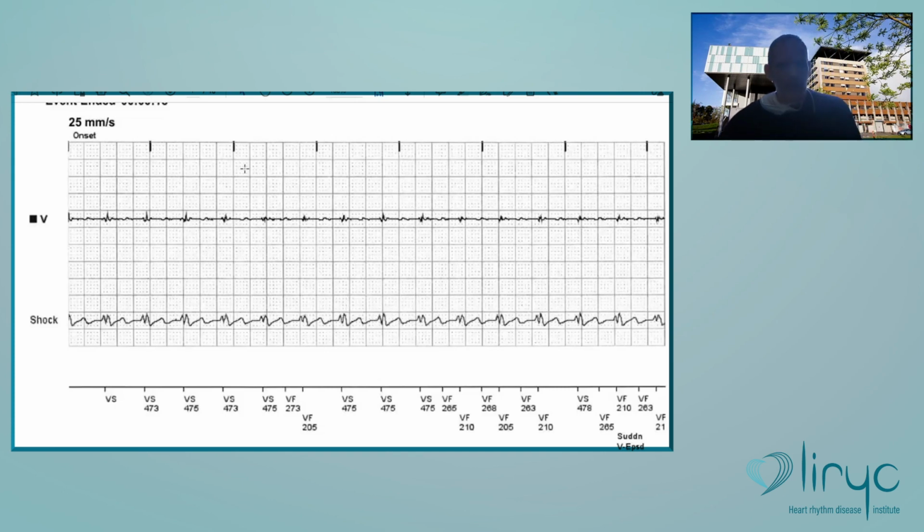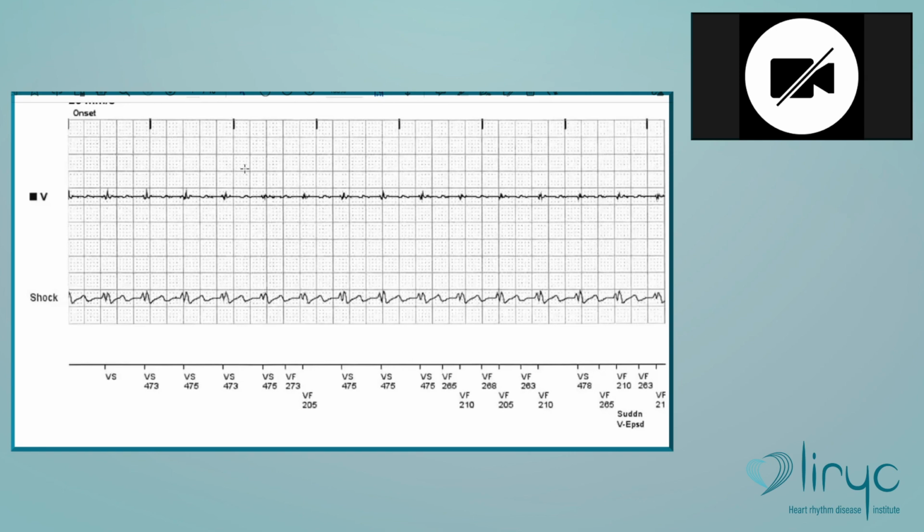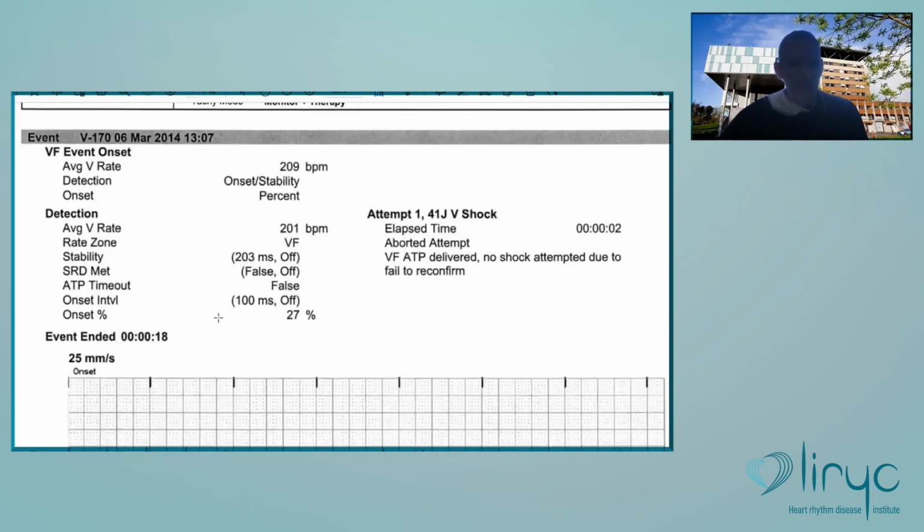Okay, what do you think here? It's probably T-wave oversensing. Yes, you see here the signal and then the T-wave oversensing. I have shown you this tracing because it is coming from the United States. Among all the patients I have ever seen in all my life with Boston Scientific ICDs, I have never seen a single case of T-wave oversensing, not one. This patient comes from the United States, one tracing I could find somewhere, but not in our centers. So just to say that it's very, very infrequent in Boston Scientific devices.